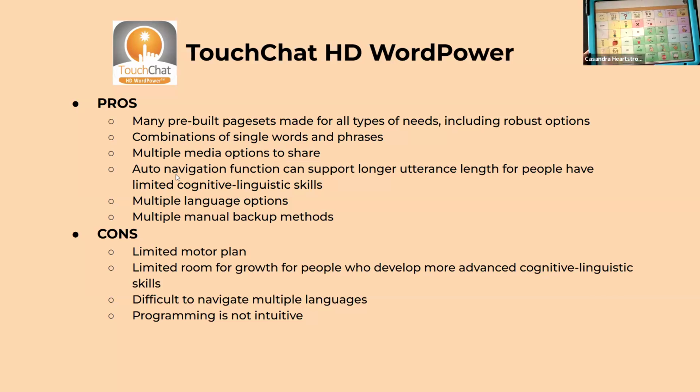So again, when you touch I, it takes you to the verbs because verbs are usually next in that sentence production. When you touch drink, it takes you to drinks. When you touch watch, it takes you to TVs and movie things.